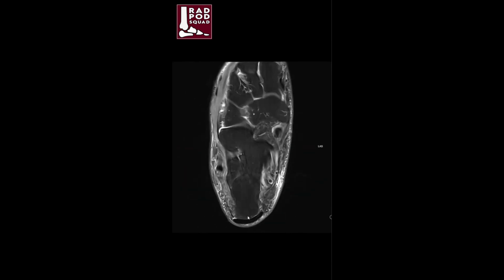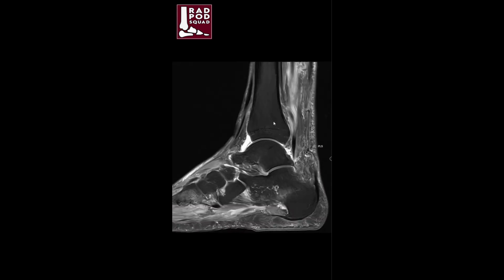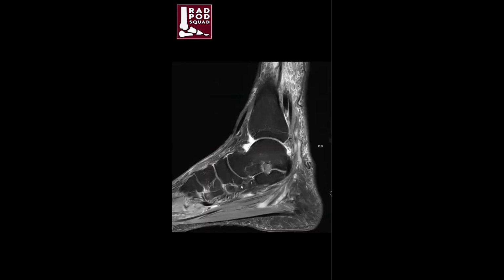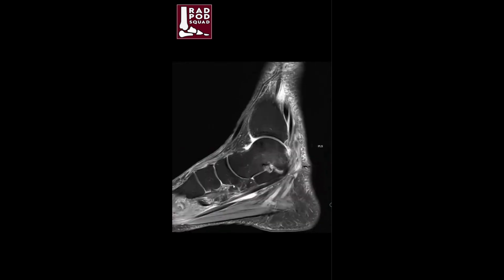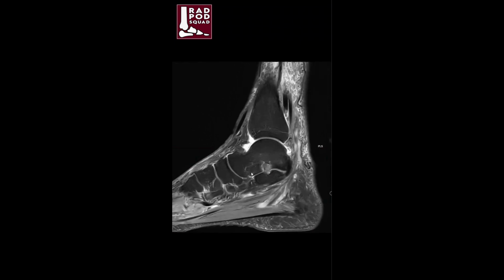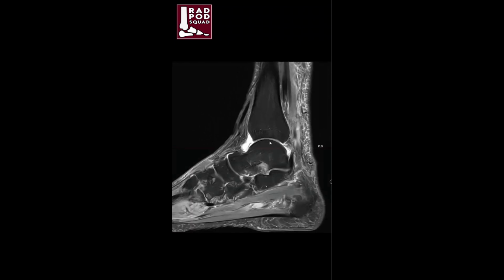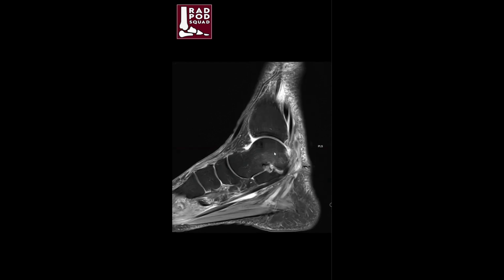Looking at the biomechanics and what we can see here, this is a tough biomechanic for people to understand, in that when we think about the sagittal alignment here, this person has a nicely developed arch. The navicular has no overlap to the cuboid, and so the medial arch is well developed. When we look at the vector of the talus and we try to understand a bisection of the dome and the neck, we come up with a vector that would probably be along the line of the first, almost to the first metatarsal, but not quite.